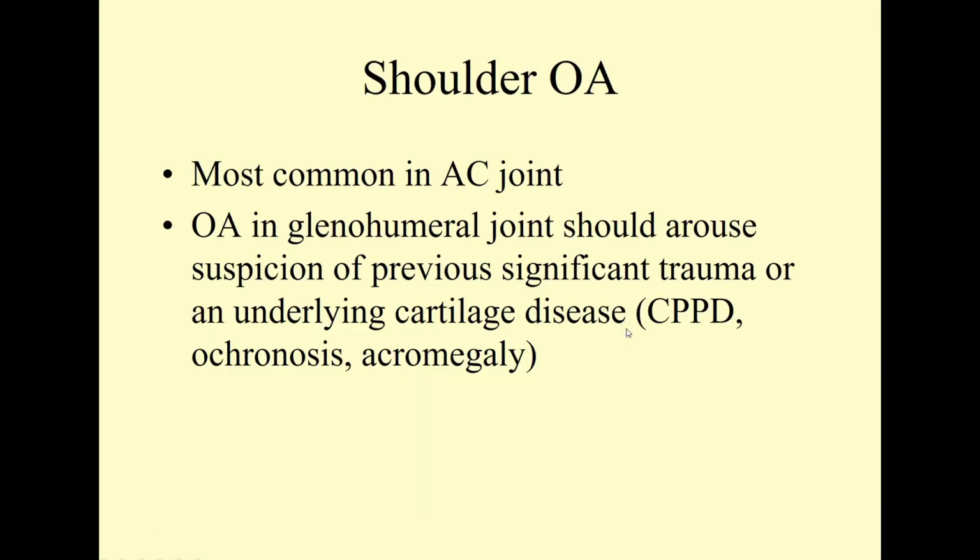Now, moving up to the shoulder, the ball and socket joint. We're in the shoulder complex. Between the glenohumeral joint and the acromioclavicular joint, the AC joint is the most common site of attack. And this is also one area that can produce a challenge for us.